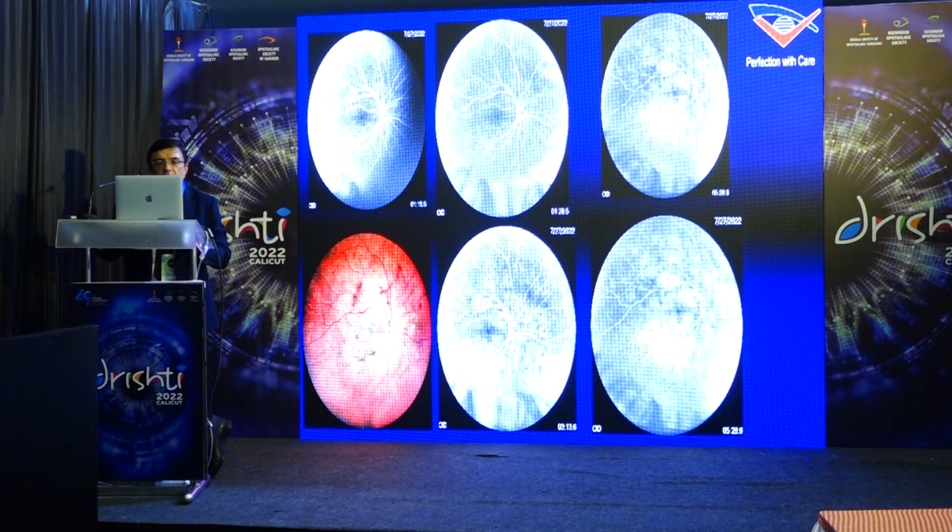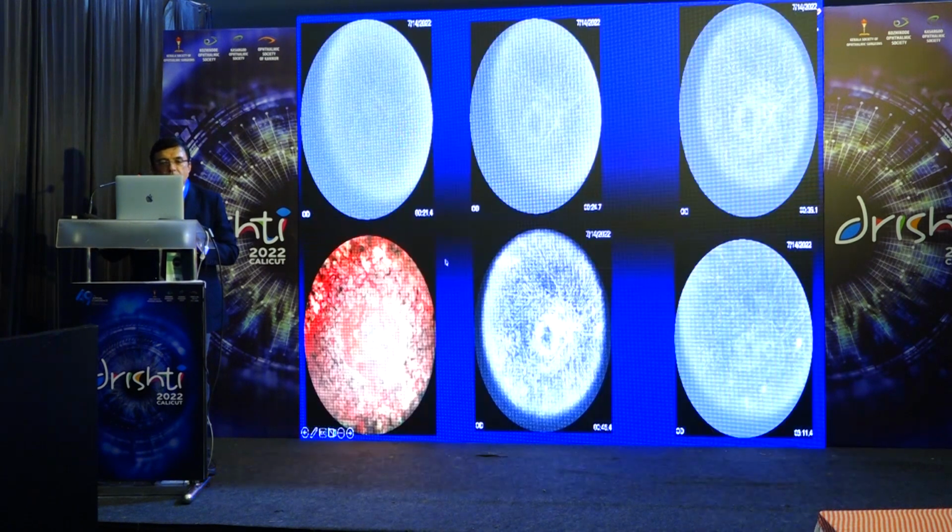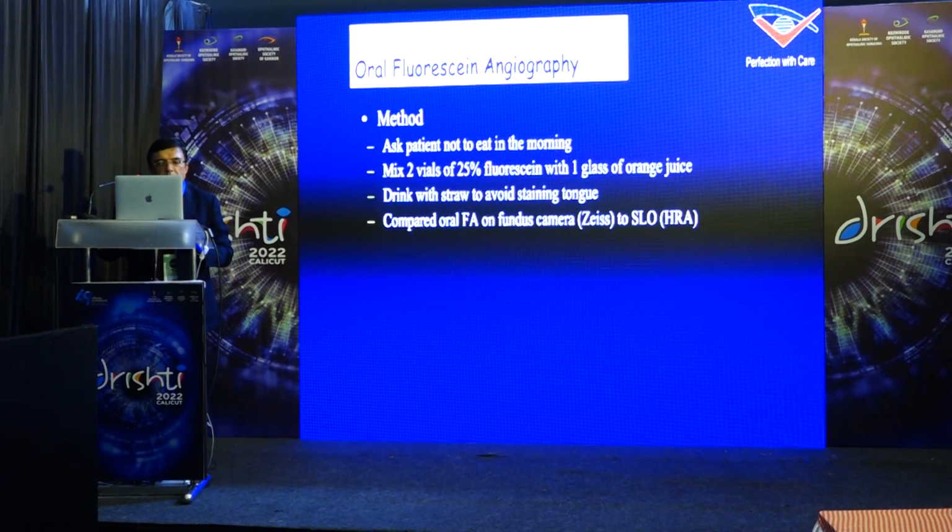Okay, so similarly the same patient in the right eye, where we are able to see, and when we do that, this is a patient who was massively lasered, and she came to us with a vitreous hemorrhage in the right eye. She had cataracts, so we thought maybe it's PVD induced, but when we looked at her angiogram, we saw that she had this NVE present elsewhere, so we went ahead, gave her an intravitreal injection, subsequently did a cataract surgery, and then went ahead and lasered her. She had been extensively lasered all over the place.